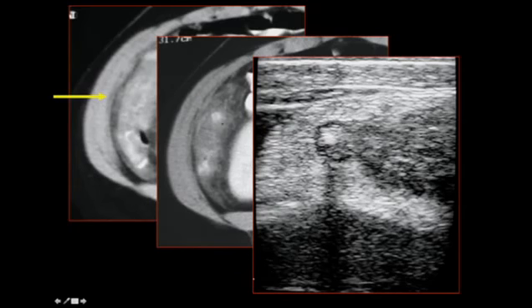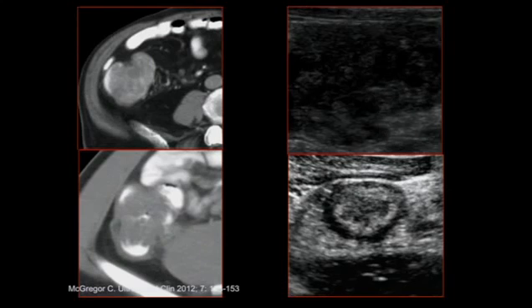The diverticulum in retrospect is embedded in this inflammation and very difficult to appreciate. In addition, on ultrasound, we were able to demonstrate that the bowel wall layers of this right colon, not well demonstrated on this picture, were entirely preserved, excluding a malignancy. So, two more patients who also presented with right lower quadrant pain, and I think have a relatively similar CT appearance in that they have relatively short segment focal thickening of the right colon. This upper patient here with normal pericolonic fat, this patient maybe with some mild pericolonic fluid and inflammation.